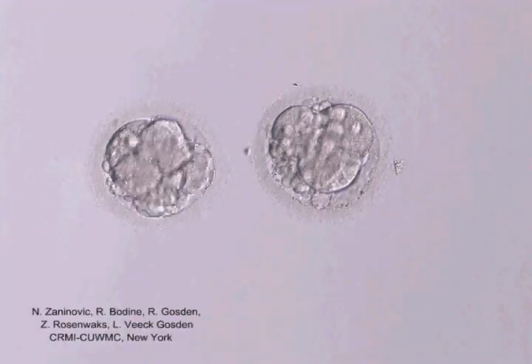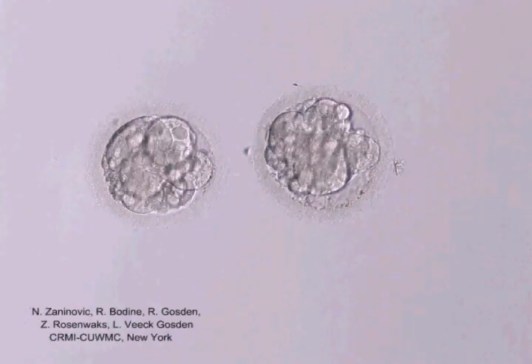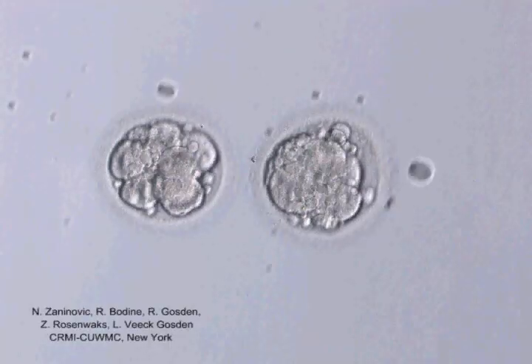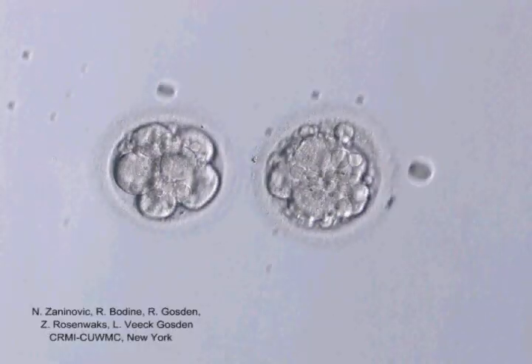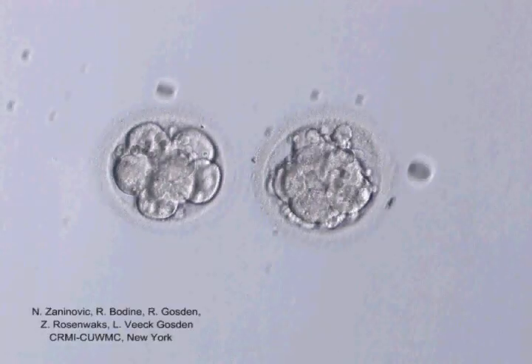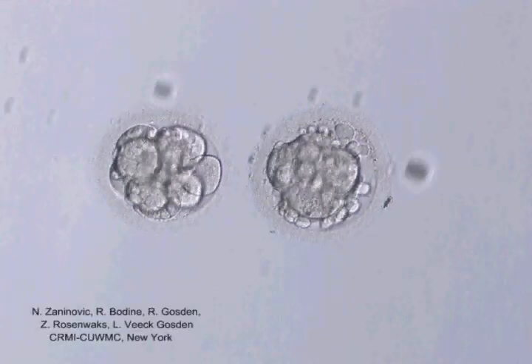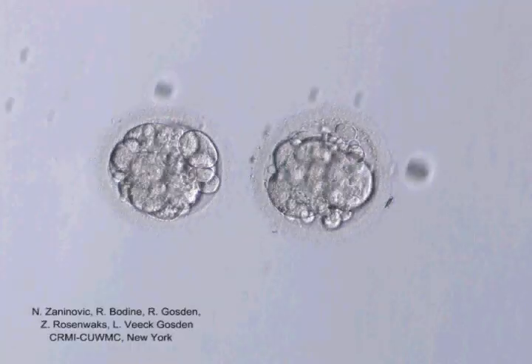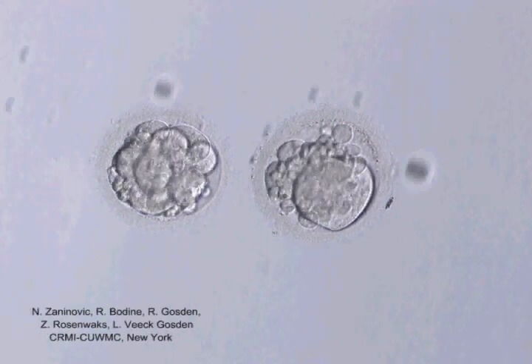Between the second and third days in culture, the embryos divide again to form 8 cells, but no additional fragments are generated. The blastomeres appear to move and pulsate within the zona pellucida until the time of compaction. At this point, the embryo on the left simply continues to increase in overall cell number. In contrast, the embryo on the right appears to be losing cell definition in preparation for the first stages of morulation. Here, blastomeres begin to develop adherence between one another, demonstrating ever tighter cell-cell junctions. Nevertheless, the resulting morula that is formed at first appears irregular, rolling freely within a framework of disassociated fragments.